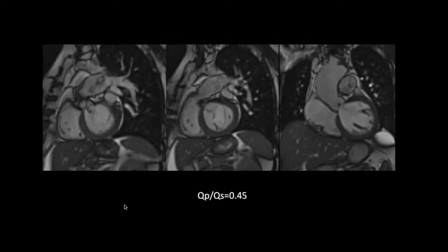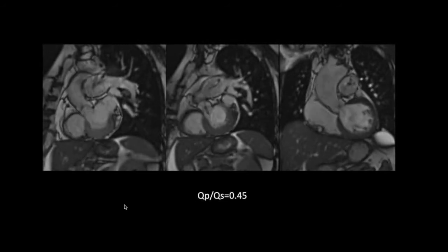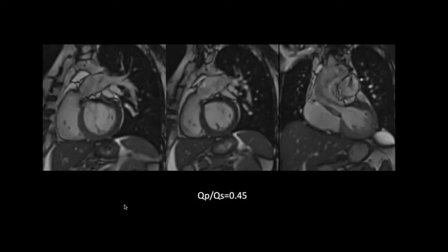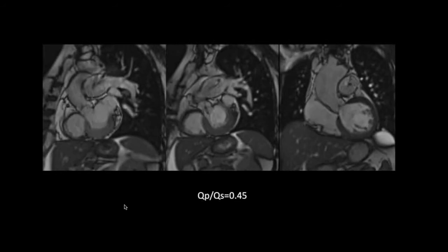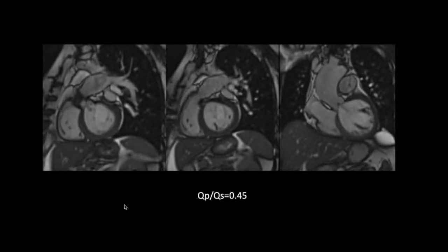And they're really, really easy to miss if you don't review, you know, the coronal and the sagittal planes. They're really hard to pick up on an axial image, and you can just walk right over them. So just always inspect that area carefully.